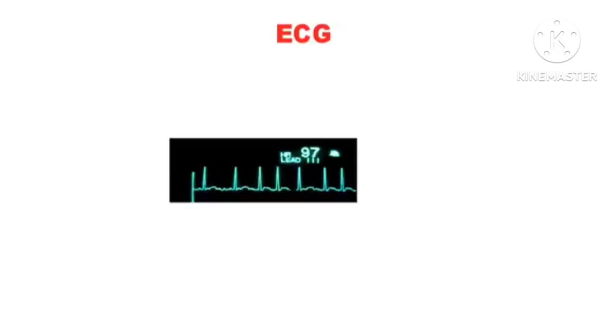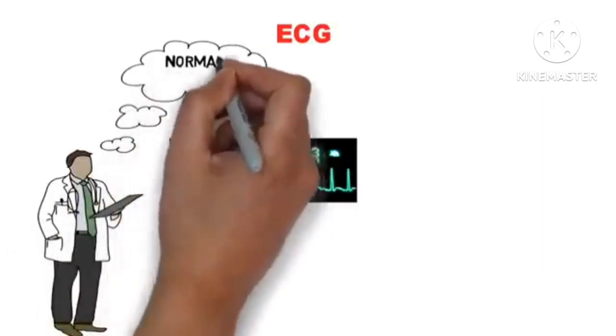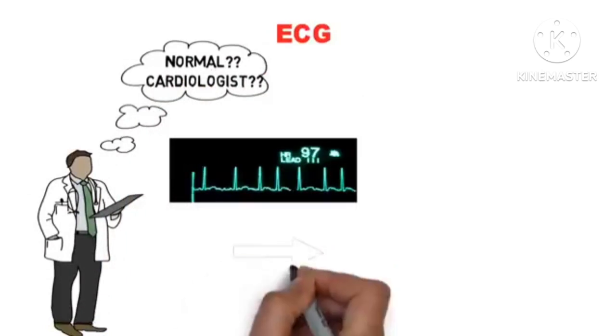So today we will discuss about ECG. This is by far the most important topic for all the medicos. Sometimes you get confused after seeing the ECG. For example, like this. And you think, is this normal? Should I call the cardiologist?